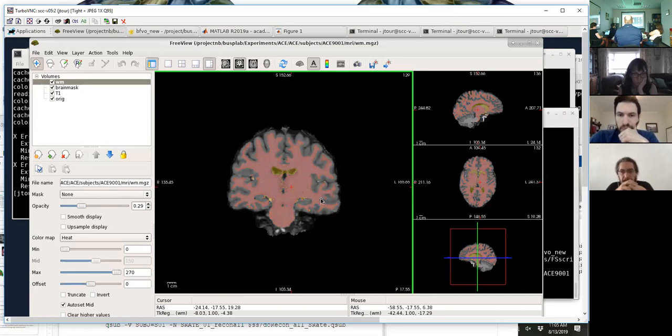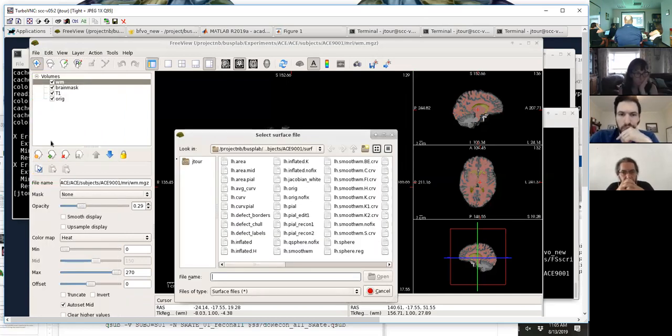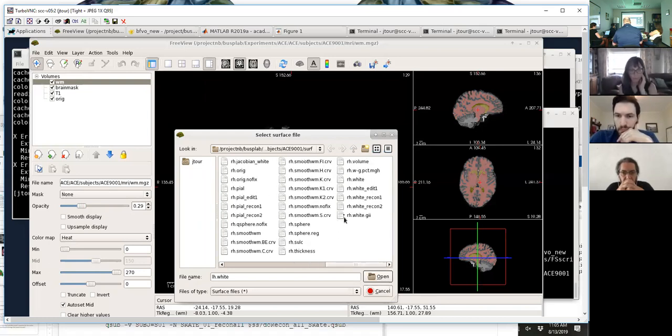Okay? Then, let's say I thought, well, okay, the segmentation looks okay, the original gray-white segmentation. Now I want to look at the surfaces that were generated. So let's say I want to look at the gray-white surface. So I go to LH.white, and actually let's do a test here. I don't know if you can do 2 of these at once. Try. 2 showed up there.